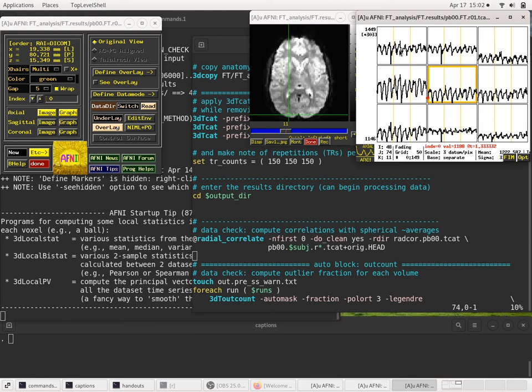This is a lot of nice stuff here. Okay, well that's great. That's good enough. So now let's get everyone to this location. I like doing this a little randomly just so we get used to hopping about, because you should practice perusing your data. Don't just assume to look at it in one way all the time. You should hop around a little bit.